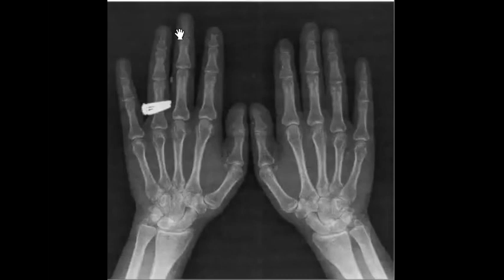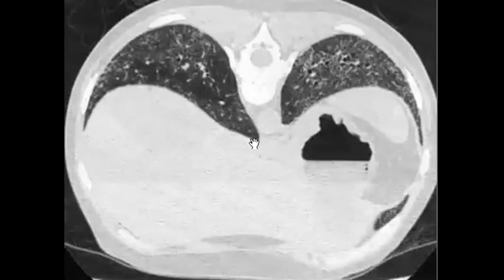Yes, exactly, Hassan. Thank you. Our big star today. There is tuft resorption, and so this patient could be scleroderma. The thing that you will check again when you go to the CT is the image of the esophagus, if it is present, to check for any esophageal dilatation.